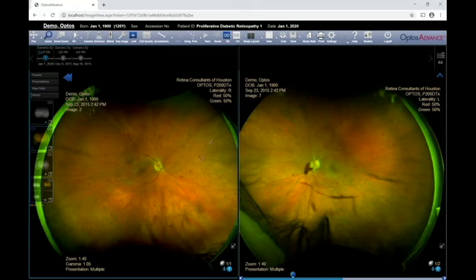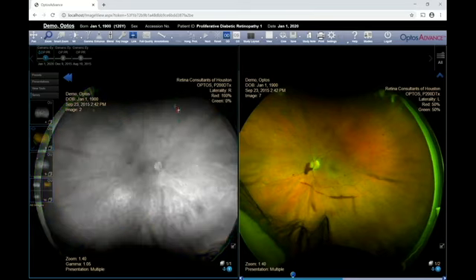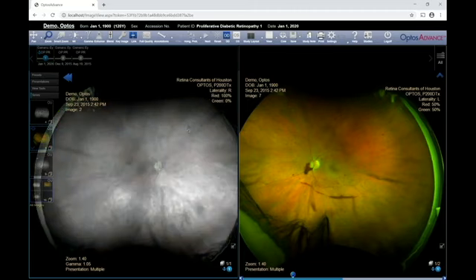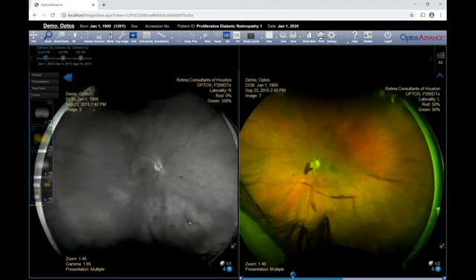You may blend to separate the red and green channels of a color image by simultaneously holding down the Shift key and the left mouse button while pushing the mouse towards the screen to isolate the red channel, or the choroid, or away from the screen for the green channel, or red-free image, with the percentage of the red and green displayed at the top right of the viewport. 100% red shows the choroid, and 100% green shows the sensory retina. You may reset to restore the image to its original presentation if needed.